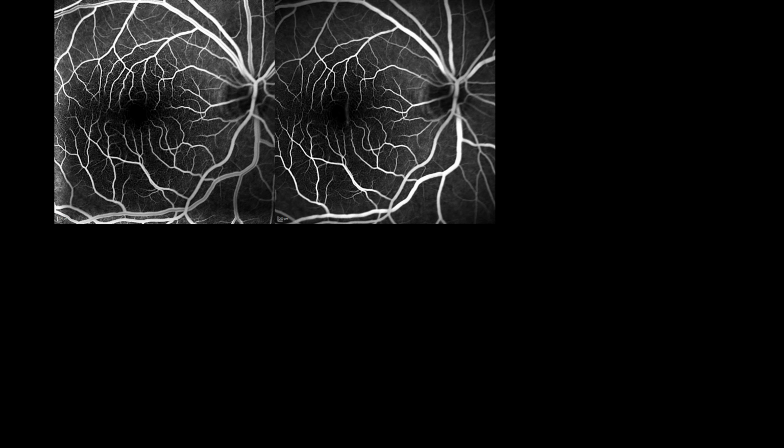Finally, I will just end with another case. So this is a case of a patient with CSCR. And this is a 30-degree fundus fluorescein angiography picture. So this is the first image. Now you look at the second image and you can make out some white thing coming here. So there is some leakage happening here, because you see this hyperfluorescence has appeared from nowhere, and we know the fovea is hypofluorescent. That is, it should be dark. We do not expect some white thing in the fovea.